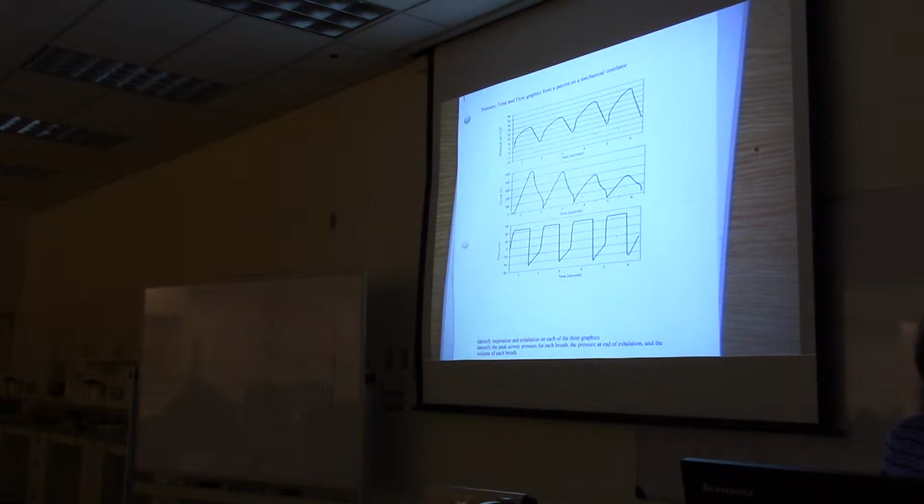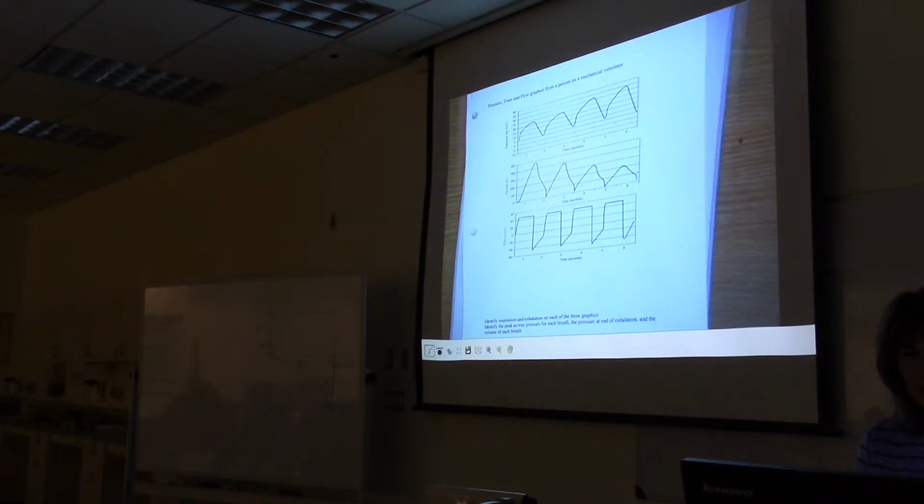And the volume of each breath? Oh, 500, so all right, like 475 ml. The second one? Like 490. Okay, around 490 ml. The third one? 300 ml, and then the last one. About 210. Okay, 210, that's good. All right, very good.